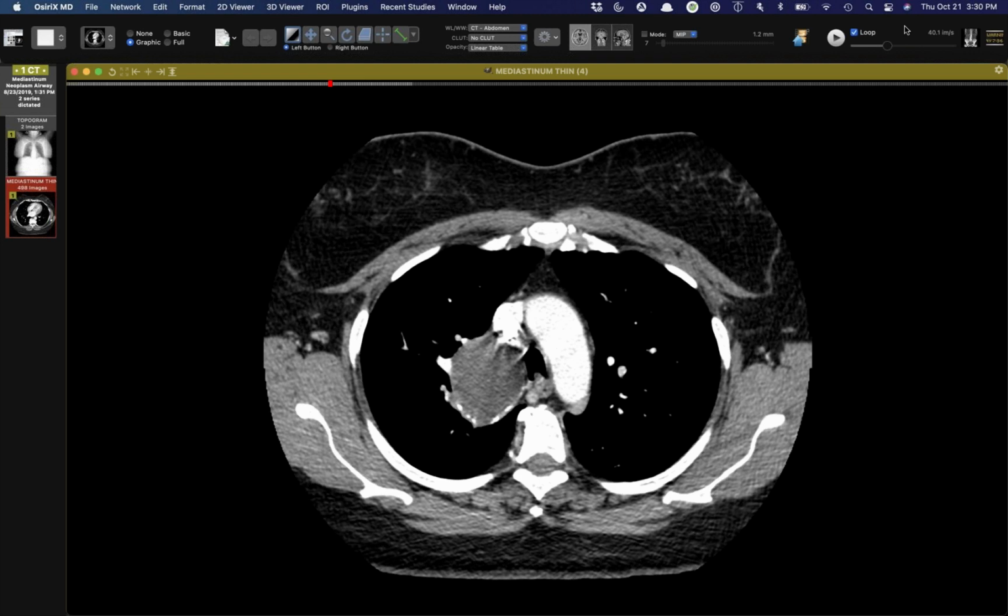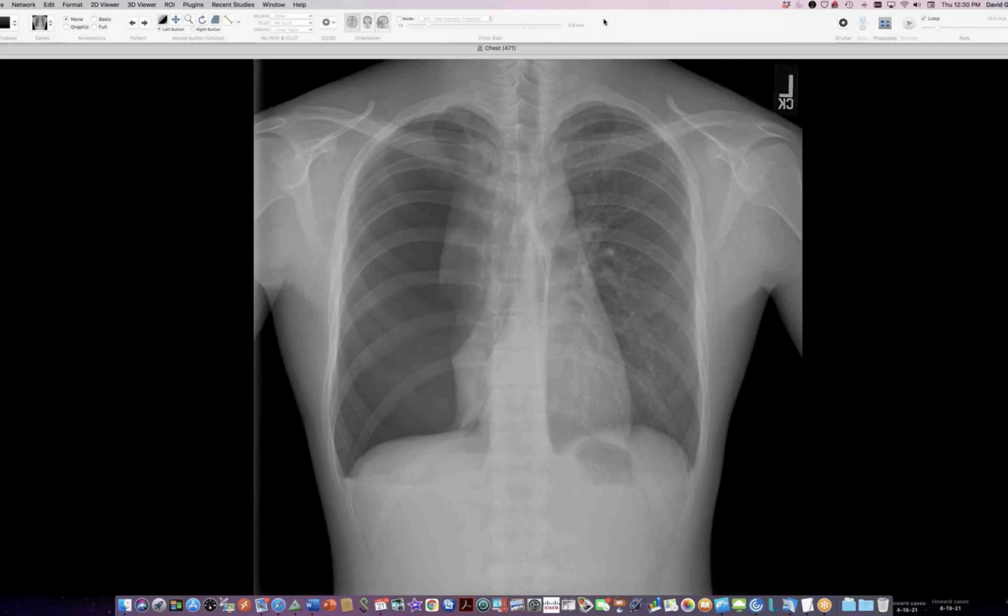Here we go. So I hope people can see a large pneumothorax. This is an 18-year-old man, spontaneous pneumothorax. He's got a little, probably blood or fluid here in his pleural space at the bottom. And the right lung seems to be tethered at the apex here. It's not able to collapse back to the hilum. So there's probably a little adhesion up there, and it might be an adhesion that tore.